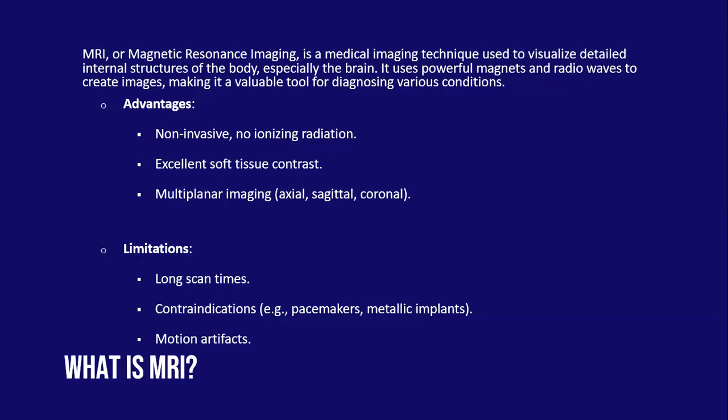So the scans that were earlier, you would see that they would have some motion artifacts, and occasionally you would have the image that you want to project not coming out as well as you would like.